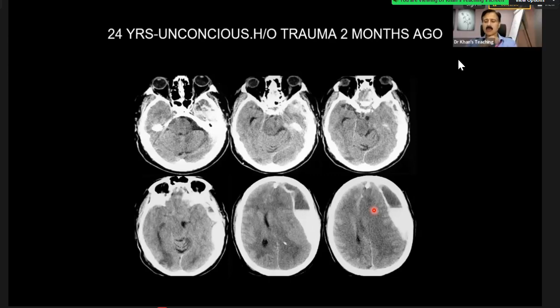Excellent. So here comes, now you are getting distinction marks for this, right? And have pertinent negatives, positives, satisfaction of search, any infarction? Okay, so having a look, there's right occipital infarction. So because of the uncal herniation, there's evidence of PCA territory infarction and associated right.